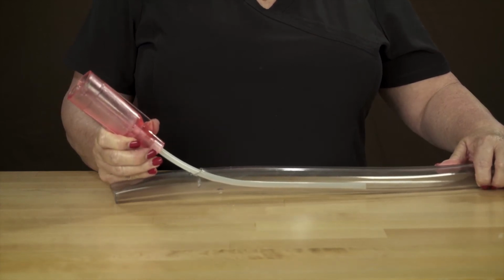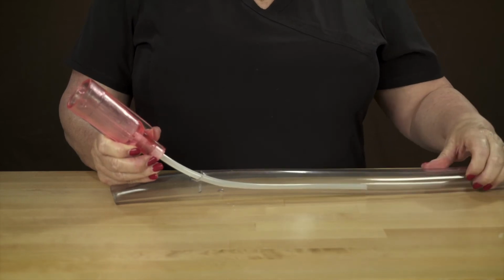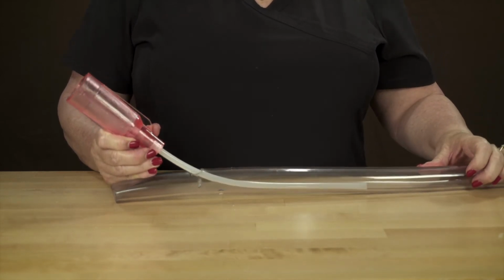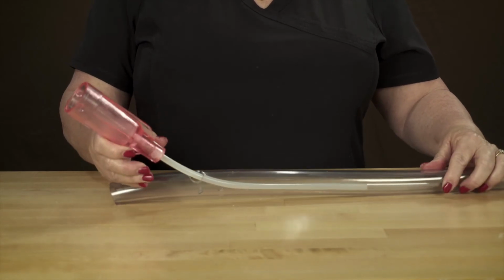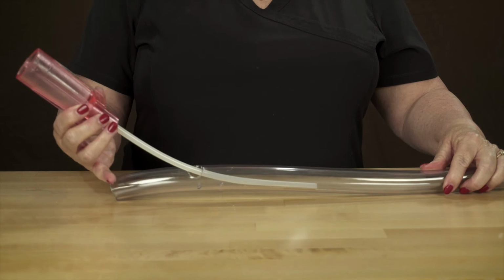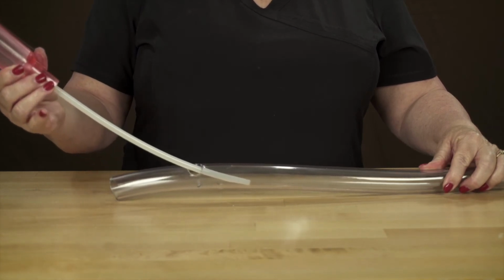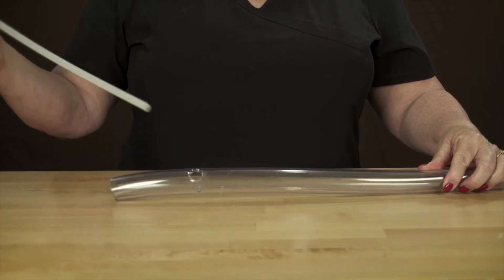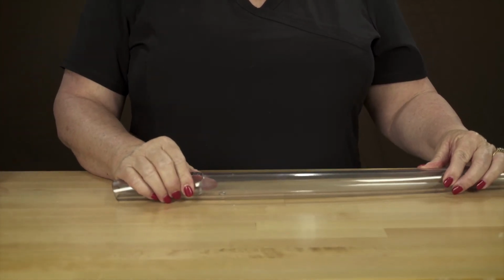Advance that same cannula to 60% of the length lying within the lumen, and it is easy to see how the tip of the cannula will be pointed in such a way as to deliver the medication parallel to blood flow. Explain how increasing edema in the overlying tissues could pull the cannula out of the vein by slowly removing the cannula. This explains the need for 50 to 60% of the cannula length to be within the lumen of the vessel.